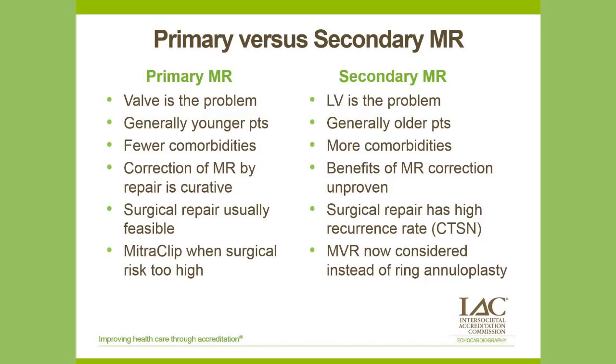Secondary MR is a totally different situation. The left ventricle is the problem, not the mitral valve. They tend to be older patients, oftentimes with coronary disease, more comorbidities, and it's never been shown that correcting the MR helps the patient. We'll get into that a little bit too. We also know that surgical valve repair has a high recurrence rate, so now surgeons are considering replacing the valve instead of doing a ring annuloplasty. I'll show you the data on that.